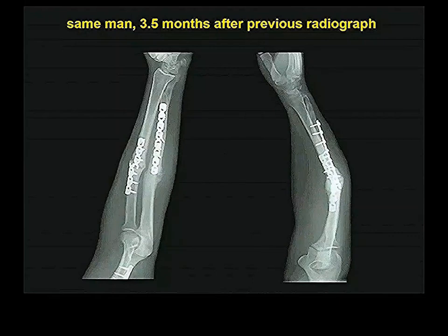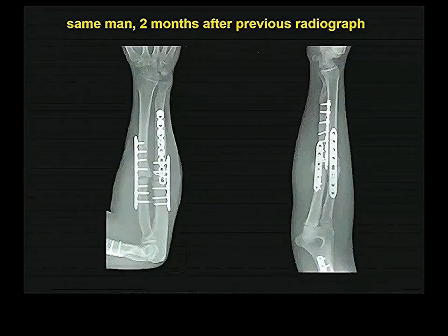But look at his arm. It's healing by callus formation, but with an angle of 35 or so degrees between the distal. So they said, that's no good. I mean, this is healed, but the whole forearm is misshapen. So they broke it again and put in new plates. I do not know if he broke it subsequent to this. But I show you these because I find it interesting. He also obviously must have broken his humerus at one point because here's a plate there.